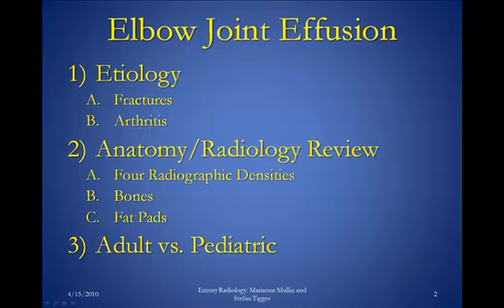In fact, normally you don't see those fat pads very well, or you don't see them at all. And if you can see those fat pads, and I'll show you an example in just a little while, that gives you a clue that there might be something going on. And the underlying abnormality that enables you to see those fat pads, like a fracture, may be very subtle, and it may be much easier to see those fat pads than it is to see the very subtle fracture. And we'll spend some time, very brief, talking about adult injuries versus pediatric injuries that may result in fat pad distension.